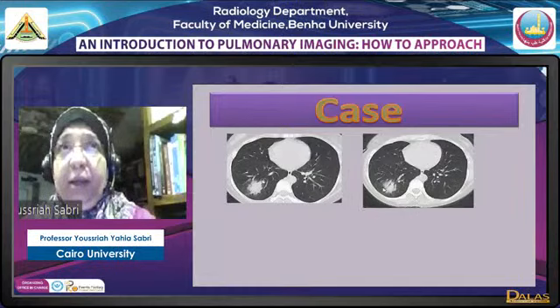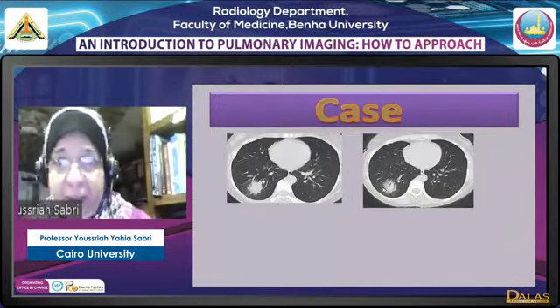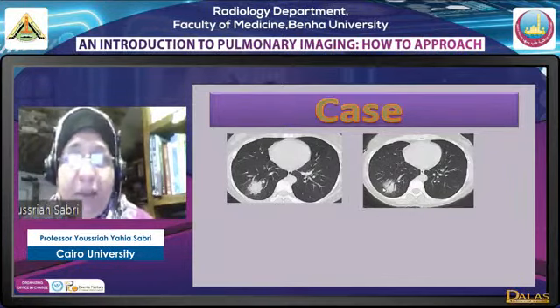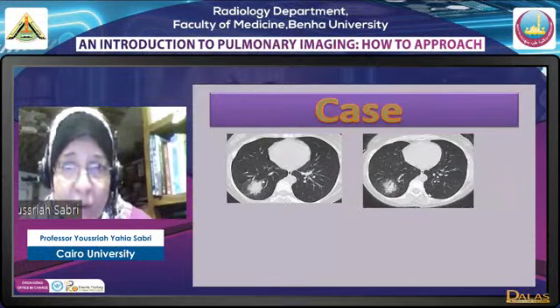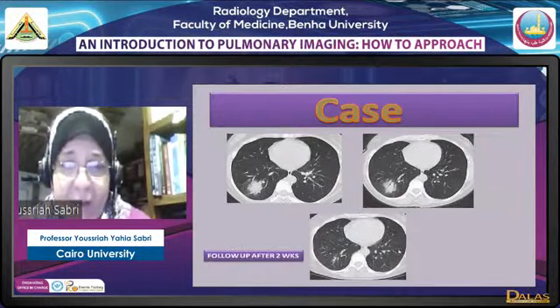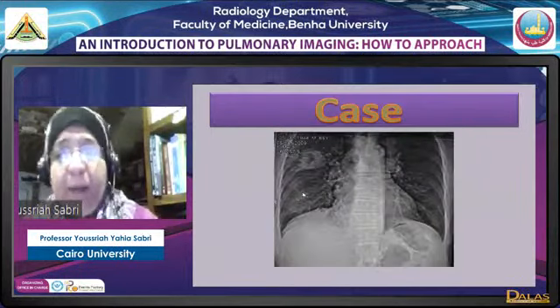احنا الكوفيد 19 الفايندنجز بتاعتها بتبقى يا اما بسبب اتيبيكال المنظر اتيبيكال انفكشن فيرال انفكشن او بسبب الاورجنايزنج نيمونيا. فده منظر من المناظر الاورجنايزنج نيمونيا اللي هو مس. 2 weeks later it has disappeared completely. تمام؟ طيب هنغير بقى في المورفولوجي شويه.